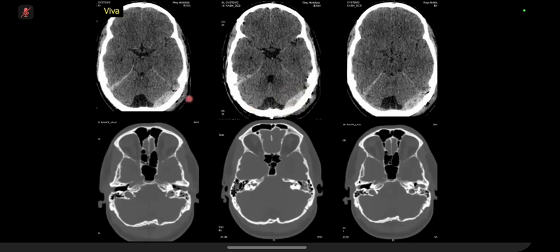I think it's, no, I will have to reconsider because it's a bone window image. Again, it's an extradural hematoma, I would say. But I would scroll through. How can it happen? Etiology, trauma. Anatomy. No, extradural hematomas. You know what has ruptured? Normally it's the meningeal artery. So what has happened here? Shear force.